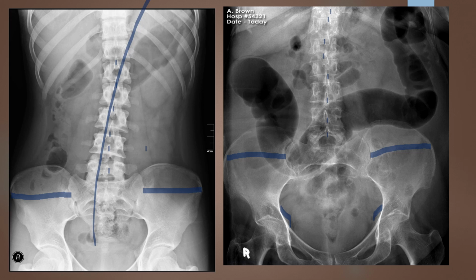Although, if you look down here at the obturator foramen, those are very foreshortened. So we might have a little bit of an angulation issue of the pelvis. It might be that they are raising their pelvis off of the table, closing up those obturator foramen. That is kind of an interesting finding.